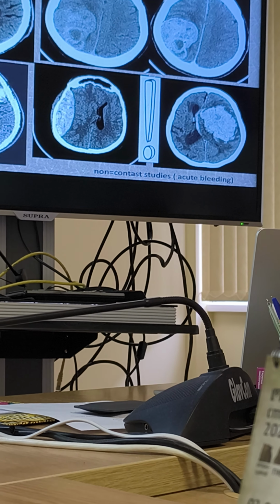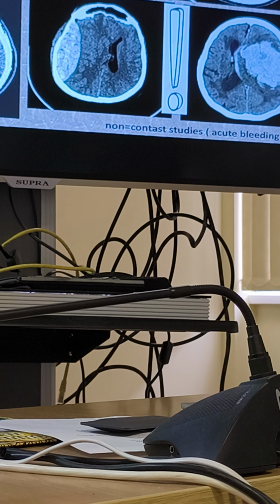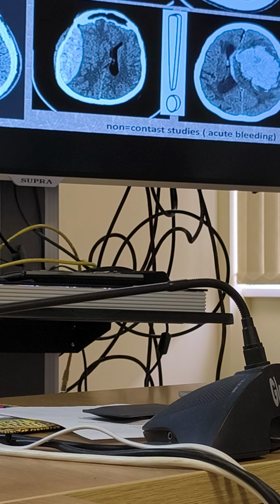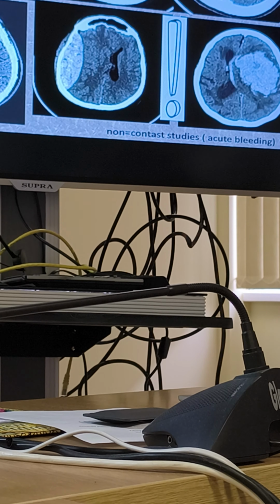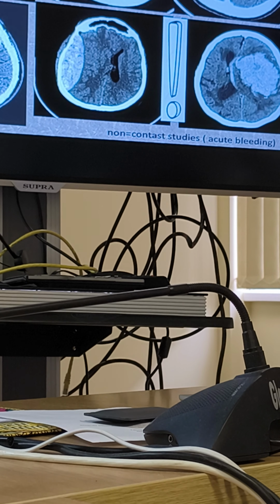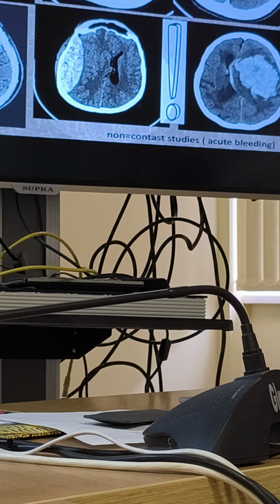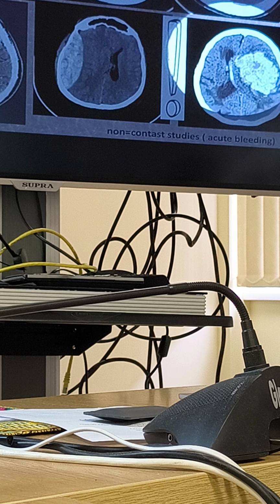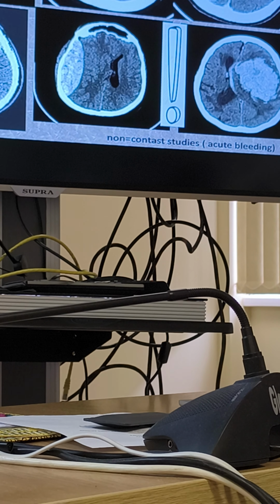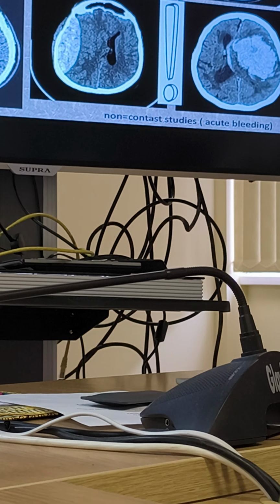The reason we see lesions in white color is because they are really dense. Not collecting contrast, not enhancing, but just dense. These are hemorrhages. These are clots. They have about 90 Hounsfield units of density. This is epidural hematoma and this is intracerebral hemorrhage. And they are white because they are dense. In this situation, we are not supposed to do this contrast enhancement thing, so as not to mix them up. So pay attention to this.